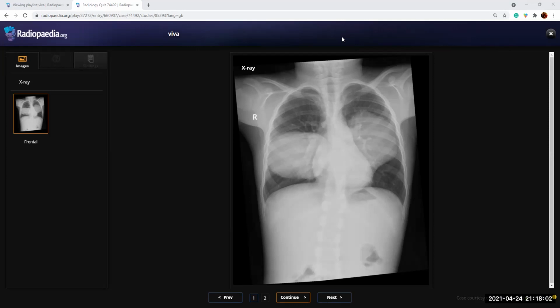So this could be a lesion on the chest wall, or this could be a lesion in the pleura, maybe a phantom lesion like fluid collection in the pleural space, or it can be a chest wall lesion. So I would like to see the previous images for comparison if anything is available, and I'd also take it further with a CT scan of the chest for further evaluation.